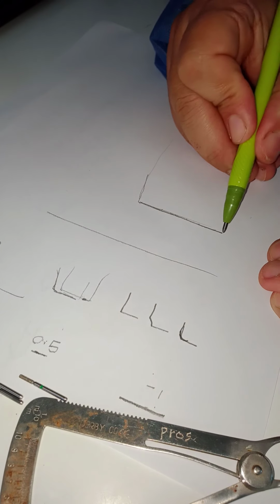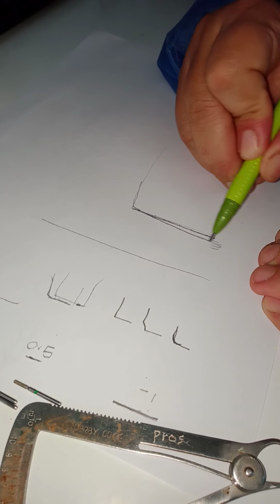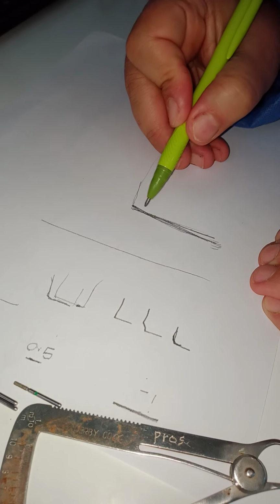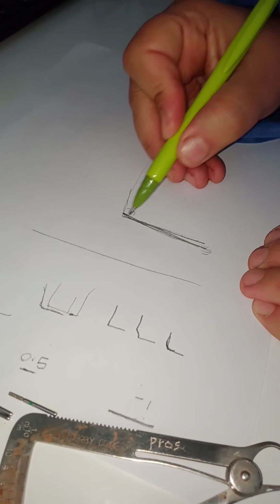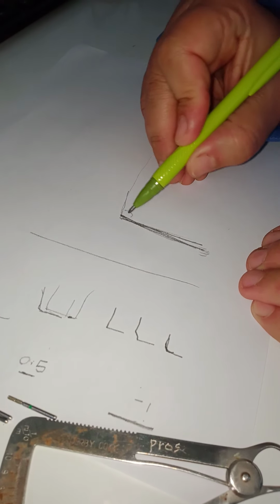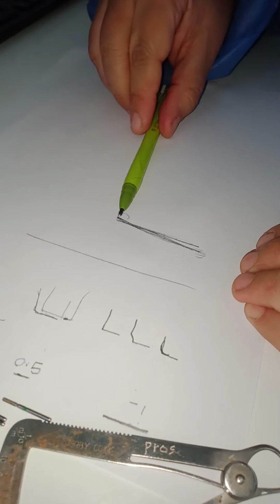This is not correct in terms of enamel prisms at the end. It's preferable that it runs with the enamel prisms, so it comes at an angle. It's not 90 degrees, it's like 100 degrees. Okay, it's a bit tilted. So how do I create that? By tilting the bur outside. At the edge, I tilt it outside, but at the axial wall, I keep the taper.